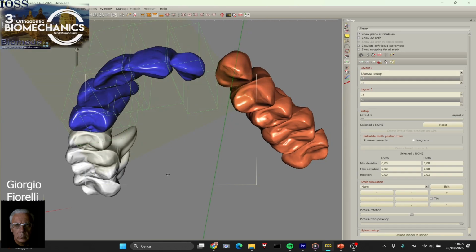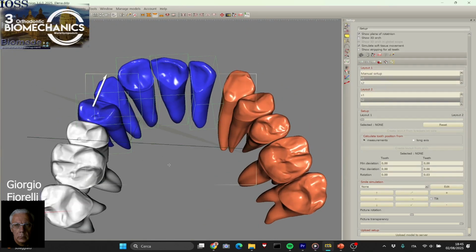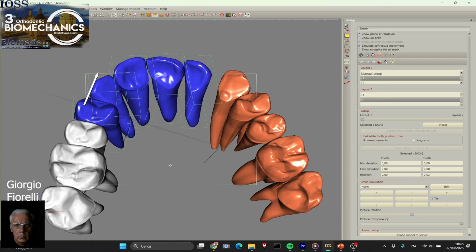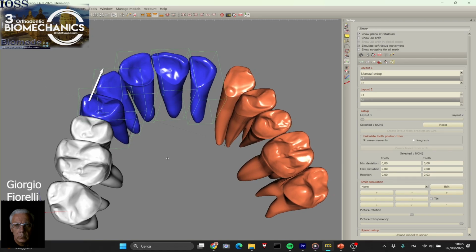Okay. Now, there is another plane that we are interested in too, which is what we call 2D plane, where actually you can simulate, and here it is, our movement and our vector calculation as if it were a two-dimensional problem. So this is it.